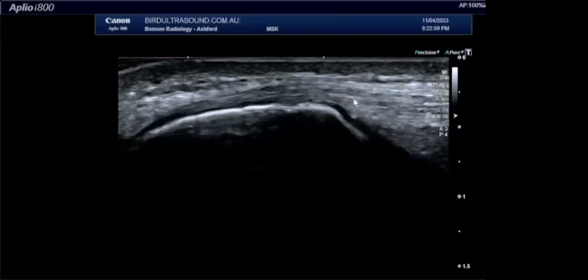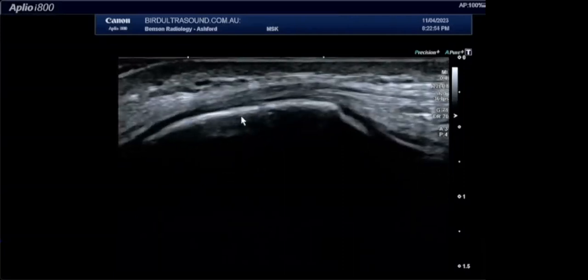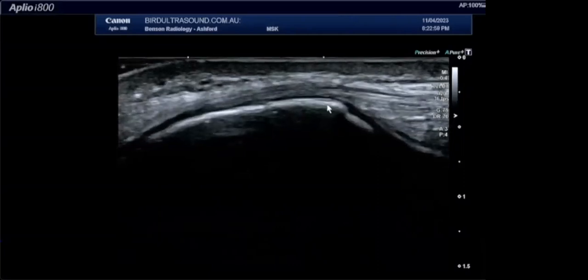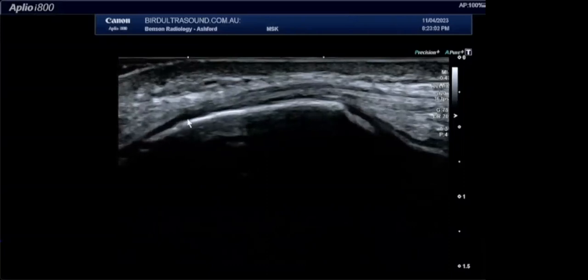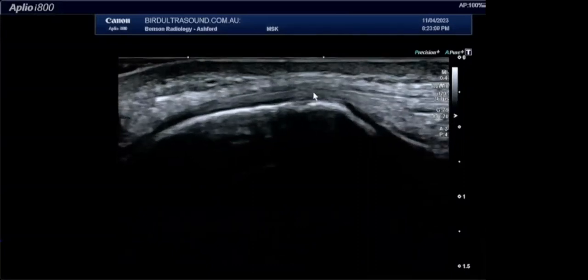So when we strip this medial joint capsule and the flexor retinaculum away from the medial malleolus, what we get is a degloving injury that certainly very commonly removes the calcified fibrocartilage from the periosteal bone underneath it here. And this is the echogenic line that you'll see stuck to the removed collagen as it strips away in that degloving injury.